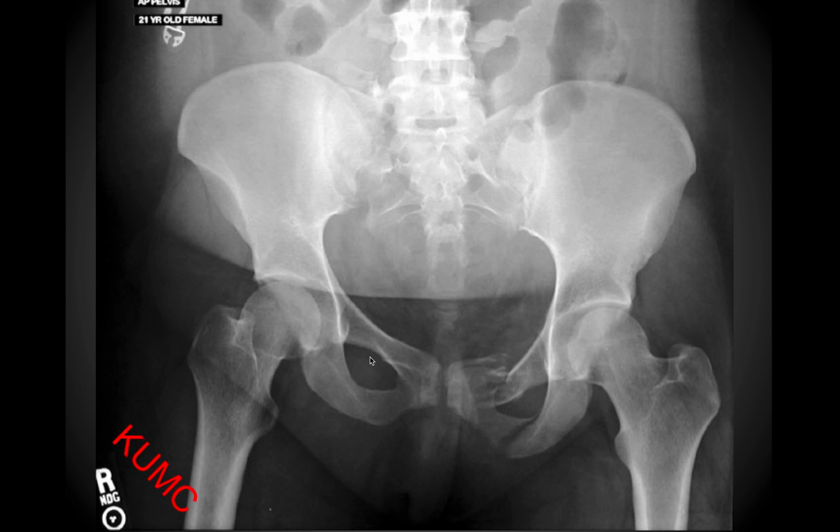And first off, you'll notice there's a very clear and hopefully obvious lack of symmetry in this patient. And so you can see evidence of two different fracture lines around the obturator foramen on this patient. So one along the superior pubic ramus and then one along the ischial-pubic ramus down here.